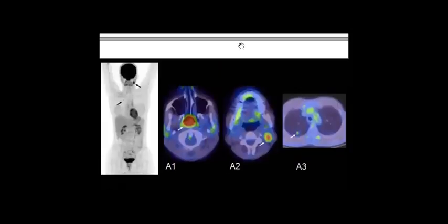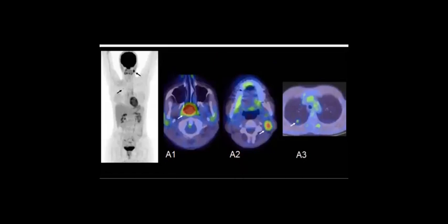Okay, I think that maybe some of you see the diagnosis, but let's try to discuss. He tried to show you something here, and something here. And in the axial, he shows you something here and here. So how do we describe them?